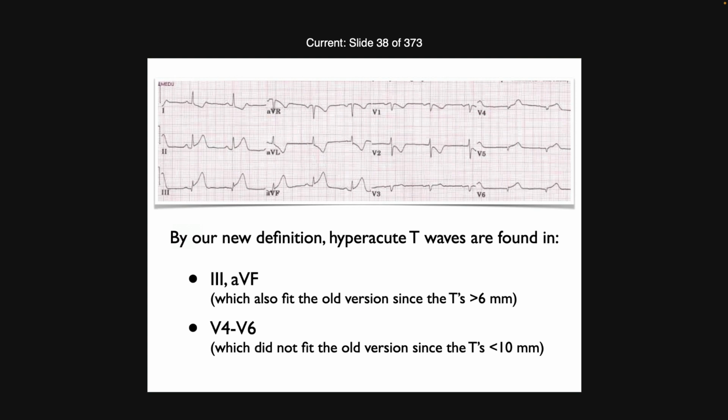But if you were to take that QRS, what we're asking ourselves now is a slightly different thing, not the absolute size of the T waves, but if we were to take that QRS and put it inside the T wave, would it fit? And you could see, or close to, these aren't absolute precise, but you can see that the amplitude of the T wave is taller than the amplitude of the entire QRS. And that's a bad sign, okay?